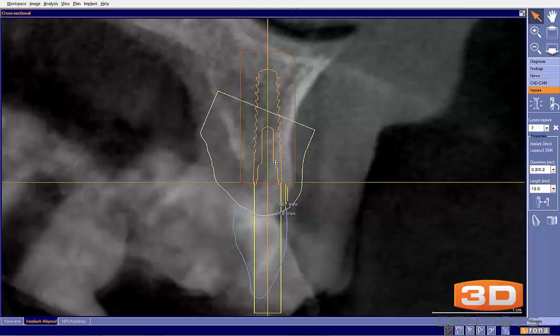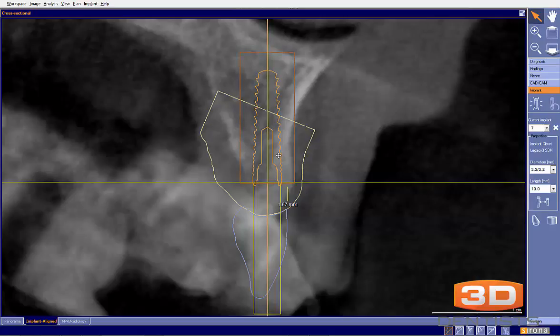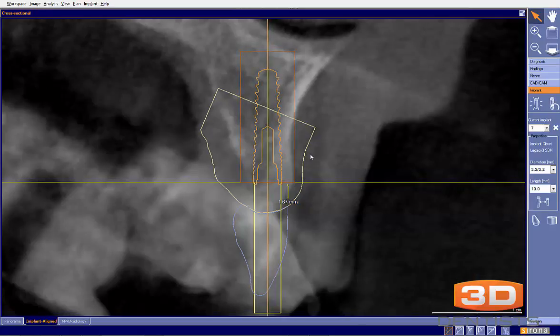My next question would be, has this tooth been congenitally missing? Congenitally missing teeth, remember, don't have altered passive eruption, so that can often cause there to be excessive bone there. The parabolic structure wasn't naturally created from altered passive eruption. And if we take into consideration that this gingival margin height may be incorrect, then this may be a more ideal positioning there.